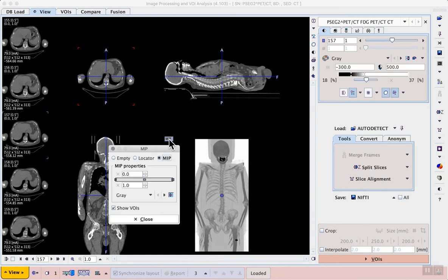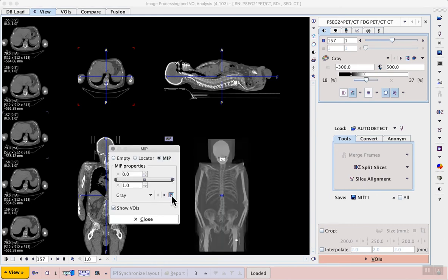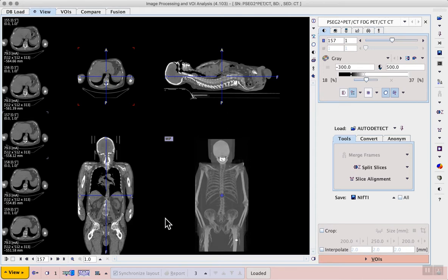The MIP can be switched back into normal grey colour scale, then we see whitish bones and high density elements as we expect for CT. And we see that the teeth and the ring are the densest part of the image, followed by the bones.